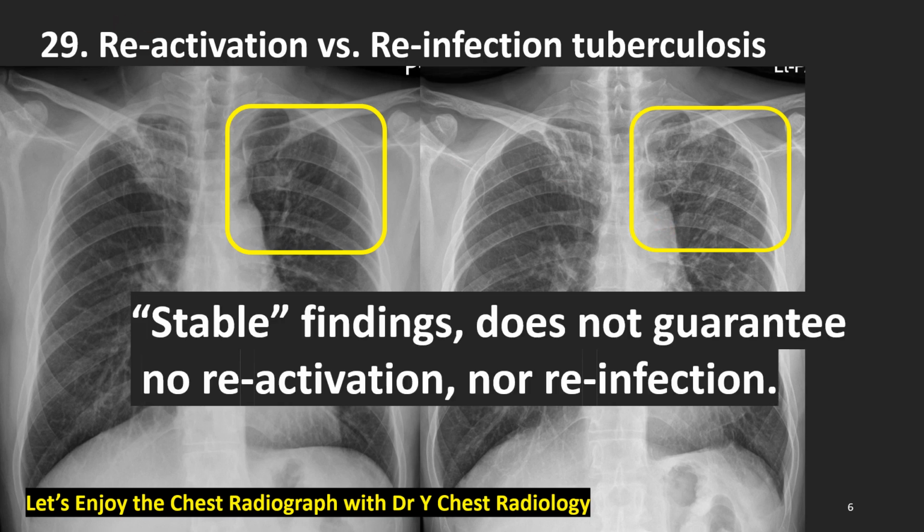Stable findings do not guarantee no reactivation nor reinfection tuberculosis. At any moment, according to the patient's condition, it can change into reactivation or reinfection tuberculosis, post-primary active pulmonary tuberculosis.